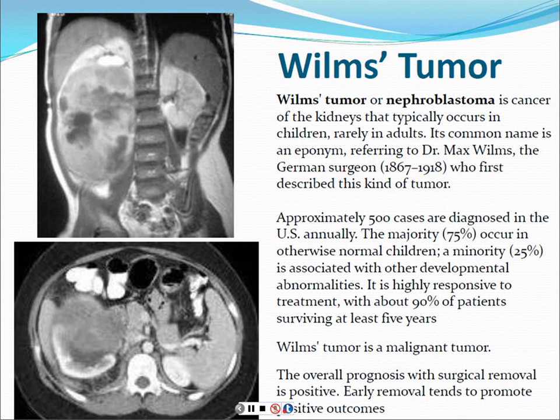They'll have to have surveillance imaging for a long time, and we like to use MRI in pediatric patients as much as possible just to decrease the radiation exposure. So you'll probably be seeing these at the time of diagnosis and also for follow-up in the future.